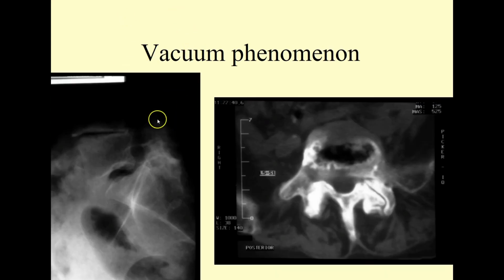Here again is another picture. Now we've got two things going on. We have anterolisthesis of L5 versus S1, and then, you can't make it out, I would never really ask you anything about this, but since we see the end plate so well, there's an additional anterolisthesis of L4 versus L5.